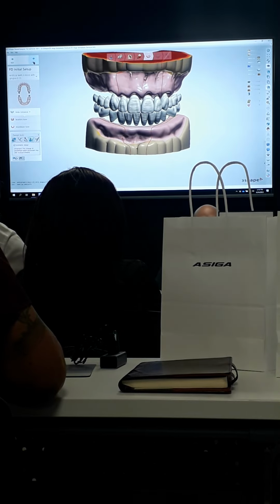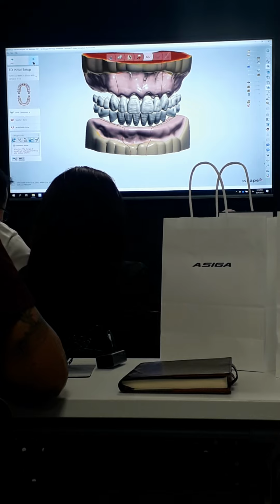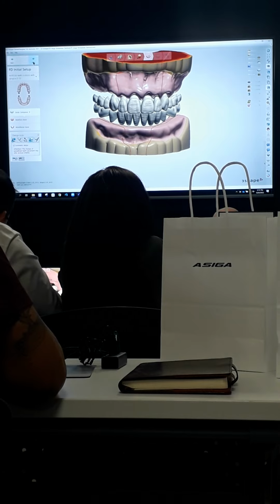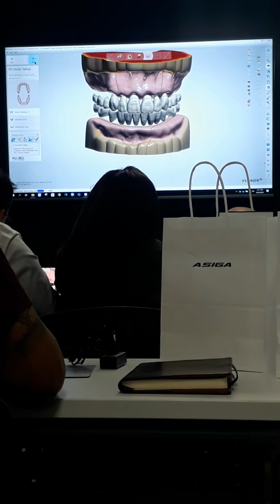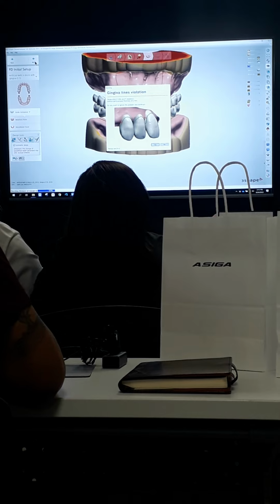So I'm going to go ahead and move forward now. Did everyone have a chance to play around with setting their teeth? It's okay. It's just to get used to the tools. You're not trying to make a perfect setup or anything like that right off the bat. So when we go next, now we're going to do our waxing. So we're going to wax our gingiva.